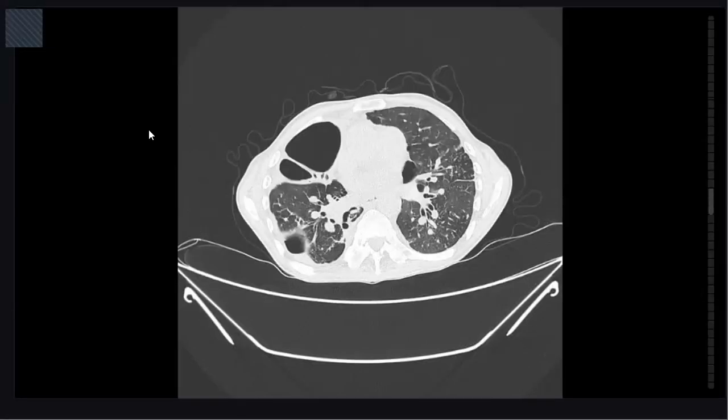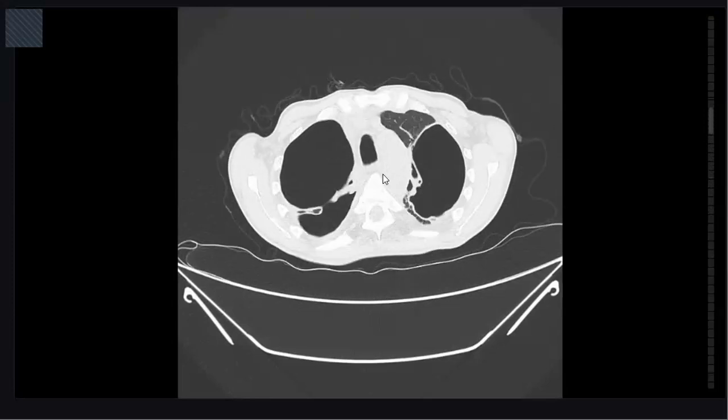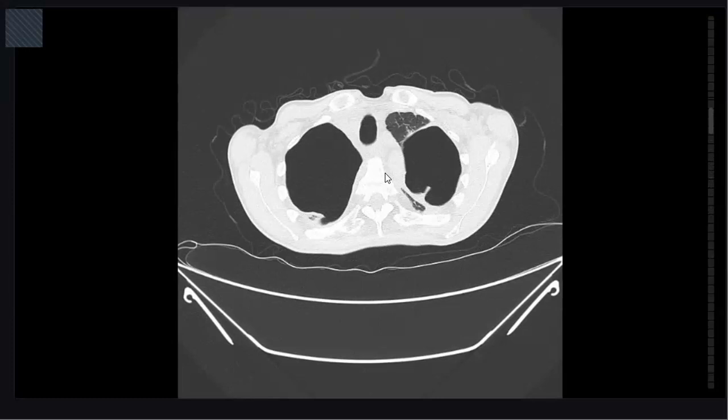Okay, unfortunately, this image stack is not working. However, this is upper lobe fibrosis. Yes, so you have a wide differential for upper lobe fibrosis. Sarcoid can cause this feature. Also ankylosing spondylitis, also cystic fibrosis, but less likely in this case. Tuberculosis also, and pneumoconiosis like silicosis can cause progressive massive fibrosis.